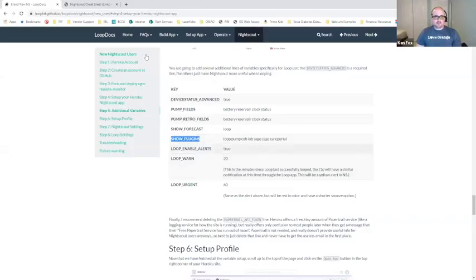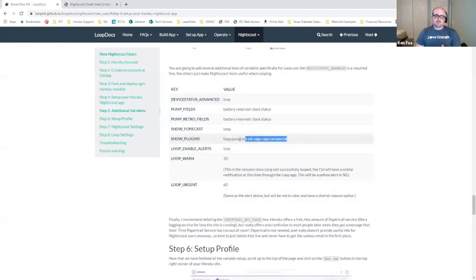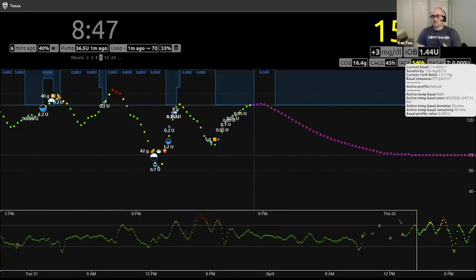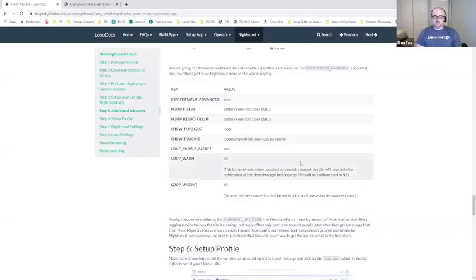I did not get mine out to show you my list, but that's what you want here. So if you want Care Portal to show up, these are good recommendations to always show. But what probably should be added here, I just realized, since things have changed, you might want to add override. You want the override pill to always be on. And then the basal, you probably want the basal rate. I like to see this basal rate icon over here to be shown. So I think that should be probably in the show plugins, for example.